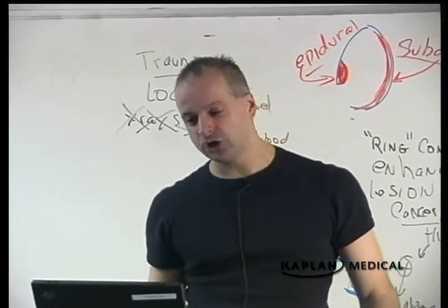This is myeloma. Myeloma, multiple punched out lesions, sometimes known as a salt and pepper skull. You see the skull looking a little like Swiss cheese. Myeloma is one of the only remaining indications for skull x-rays.